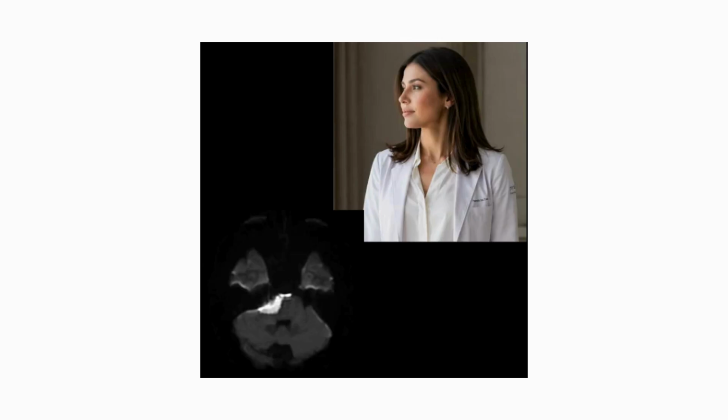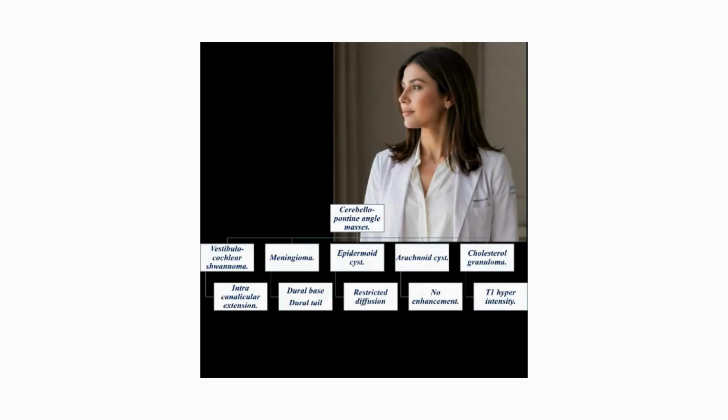Introduce diffusion-weighted imaging, DWI. Show how the restricted diffusion reveals the epidermoid cyst, but if it is free diffusion, it will be arachnoid cyst. Cerebellopontine angle masses can be summarized in the following smart art.